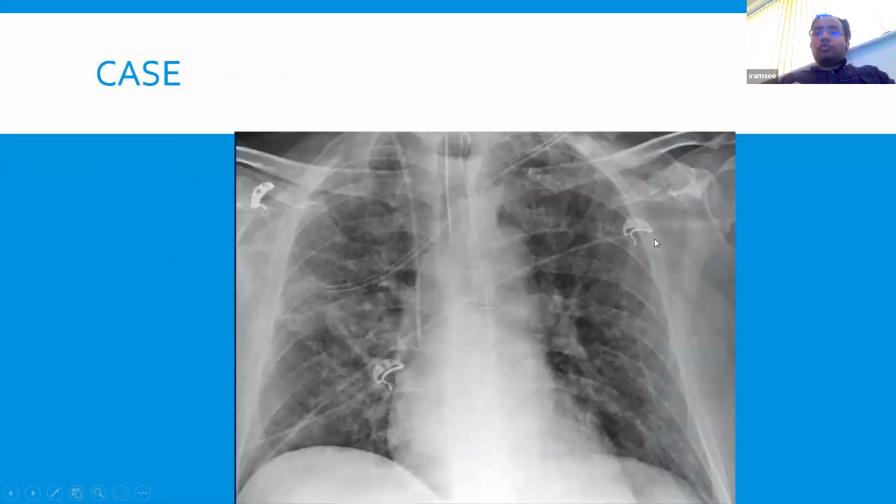Okay, so what do people make of this very crowded looking film? We'll give it another 15, 20 seconds.